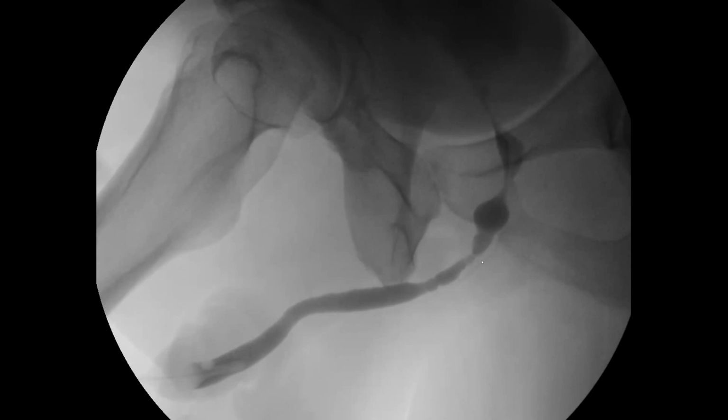For us on fluoroscopy, we can't do any measurements unless we calibrate. So I always make sure that I have a scout so I can calibrate it against one of these bones. But it basically was narrowed at the narrowest part down to 3 millimeters, and then a little bit of upstream dilation. So this was related to STDs, and the patient was having urinary retention and even reflux into one of the kidneys. They had already had one laser dilation.